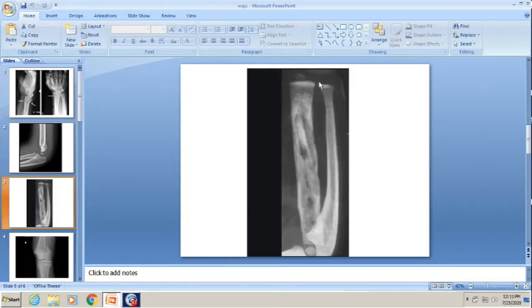First you see, is this bone looking like a radius? It is very much broadened as compared to the other. Yes, sir, it is very broad. Very broad. So in chronic osteomyelitis you find irregular broadening and thickening of bone. So you are getting here irregular broadening and thickening of this radius bone. This is one feature you can appreciate from this X-ray. Okay. What else are you getting?